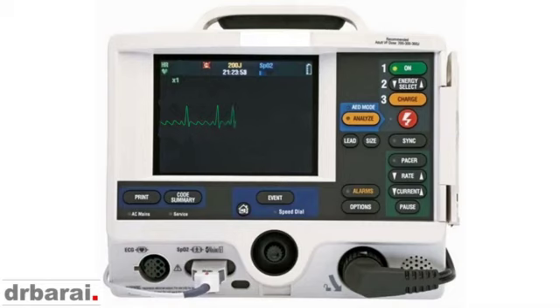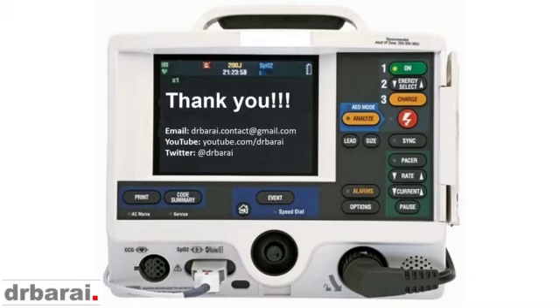How do you treat it? The same way as atrial fibrillation. Identify the cause, treat it, and if required, we can consider synchronized DC cardioversion if the patient is anticoagulated and sedated. So these are the various types of rhythms that you can pick up very quickly with a defibrillator machine.